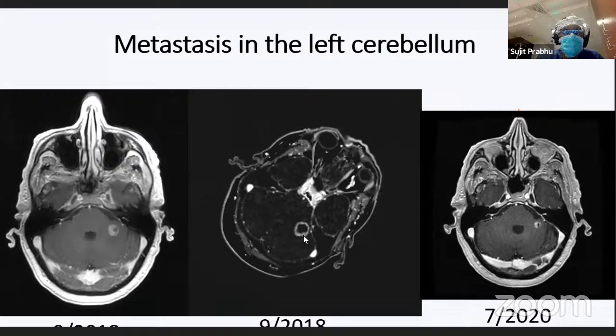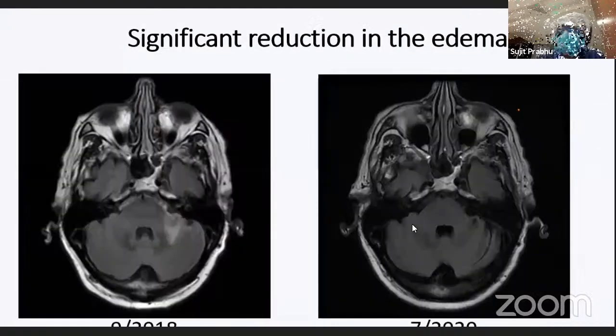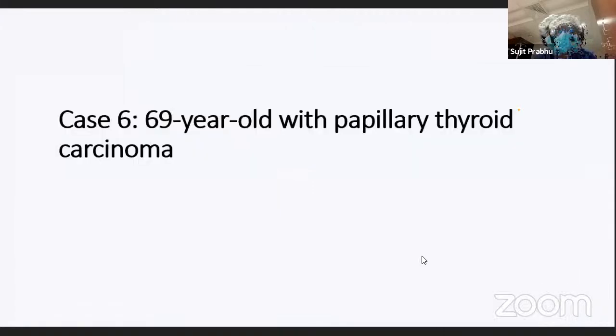You can see this is an immediate post-op scan done in the brain suite. And you can notice that there is slight enlargement of what the mass would be. And that is not uncommon. Sometimes we see some associated edema related to this, which can be treated with steroids. And again, just to show the edema pattern significantly improves after this treatment. Obviously, it is time dependent, but in most cases, we see a very nice reduction in the amount of edema you see on these scans.